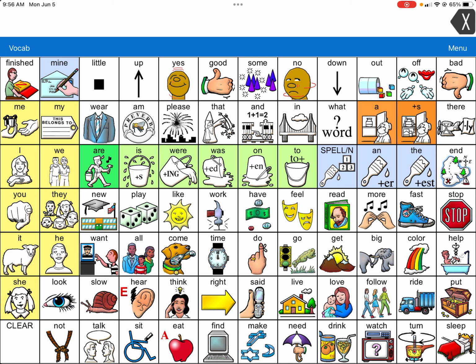So what I have ahead of time is I pulled up on my phone the Apples and Bananas song, and I have it ready to just play that one sentence. I don't want to play the whole song, just that one sentence. So I have it ready to play. And so what I'm going to do is I'm going to go to the little eat section.